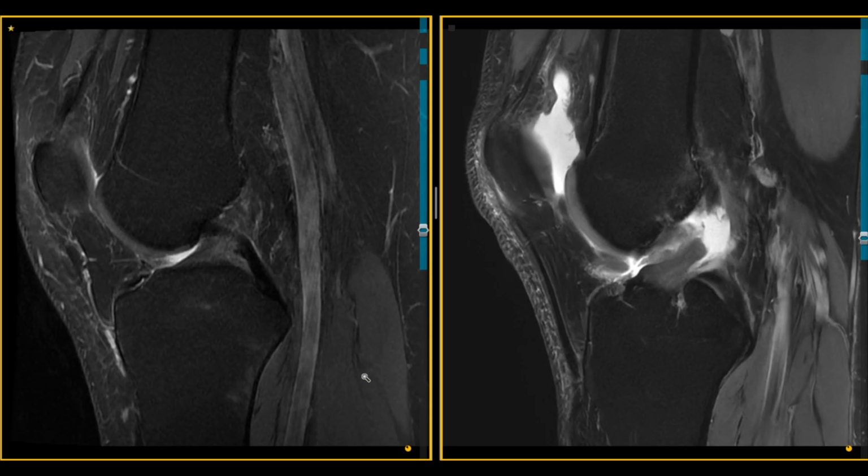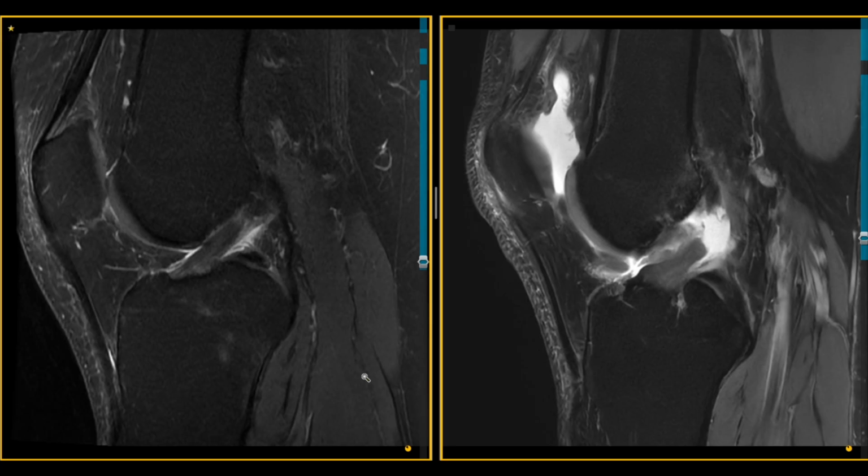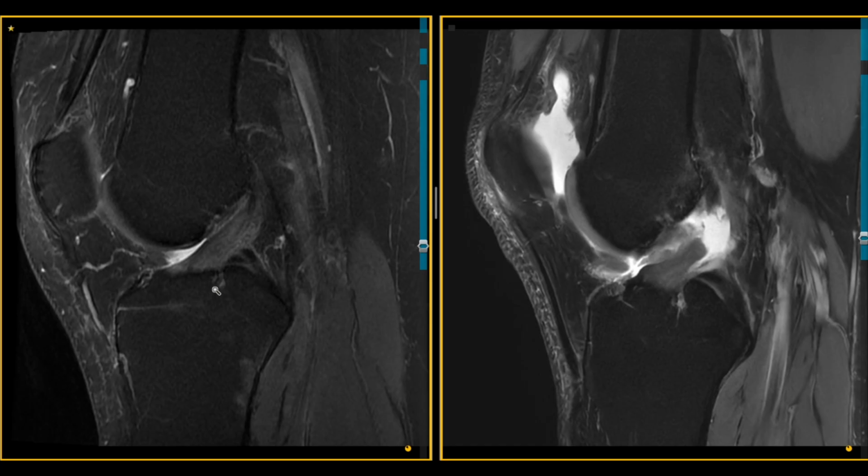Here is a follow-up MRI demonstrating the outcome of a contiguous ACL from femoral to tibial footprint of the ACL. This ACL is fairly uniform in its signal intensity and has a trajectory parallel to Blumensaat's line, compatible with a normal thickness taut ACL healing, whilst on the other side of the screen we've got the non-healing outcome, whereby you can see that the ACL is attached to its tibial footprint.